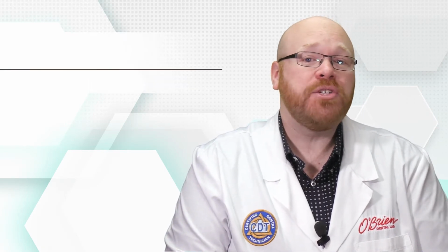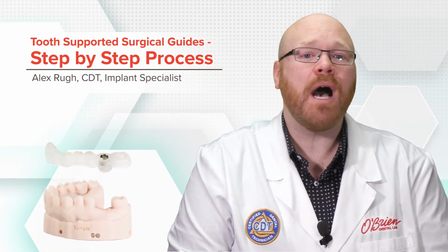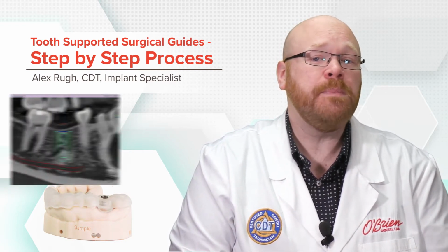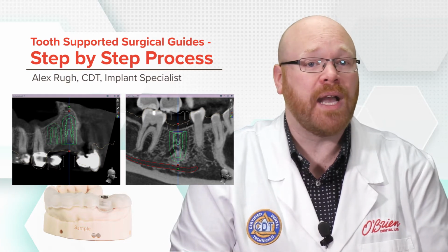We often get questions about the process for making surgical guides, and in this video, I'm going to talk about the steps for making a guide that is tooth-supported. Tooth-supported guides can be used to plan either a single implant or multiple implants as long as there are enough teeth in the arch to support the guide.